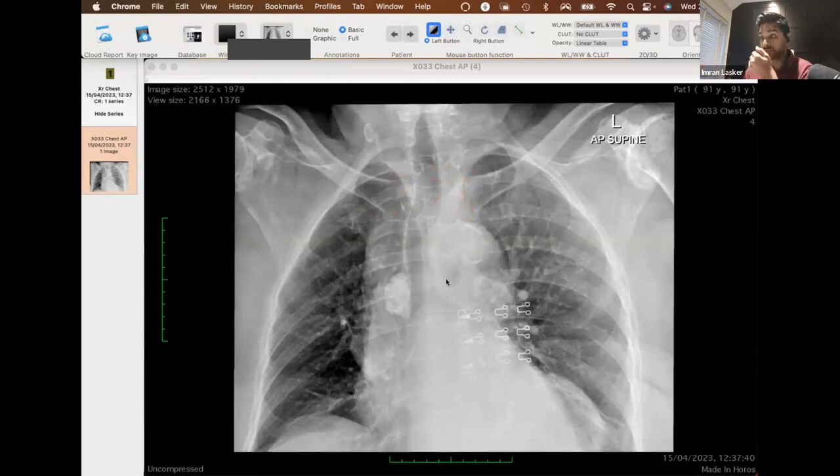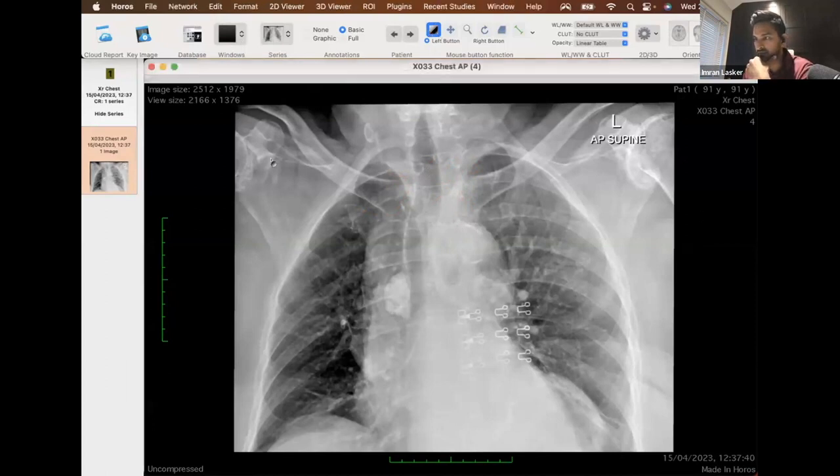With this one, we do have a question to come up. What do we think is happening here? I said, which one of these do not cause these appearances? People are putting in their answers. I'll look at those answers in just a minute while we work through. I assume people have noticed that there is something clearly quite abnormal with regards to the mediastinum.